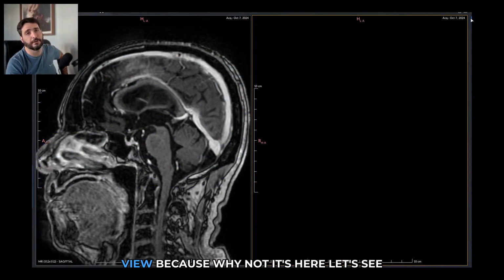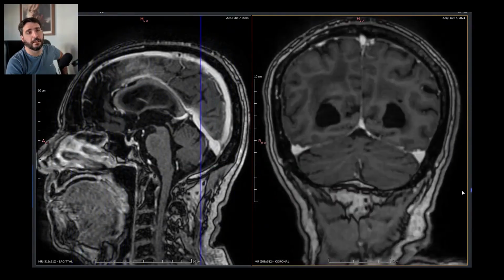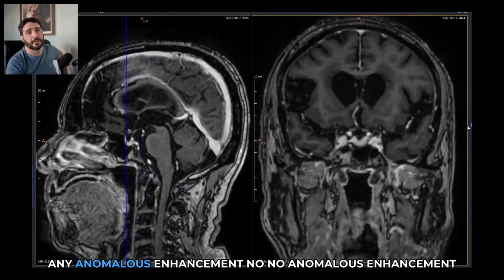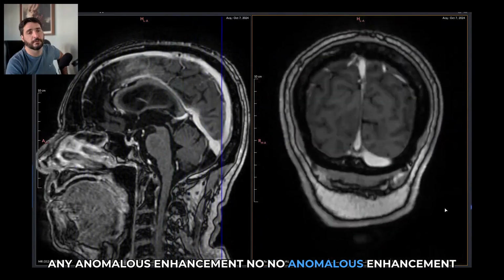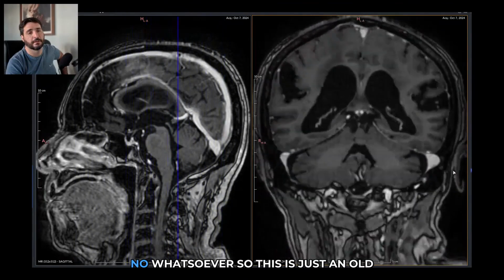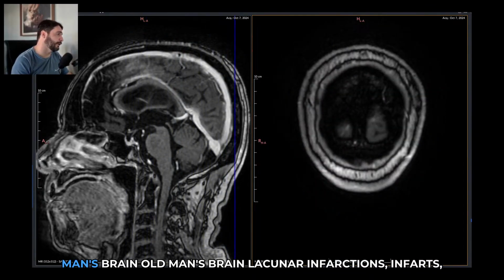Let's see coronal view, because why not? It's here. Let's see if we have any anomalous enhancement. No anomalous enhancement, none whatsoever. So this is just an old man's brain.